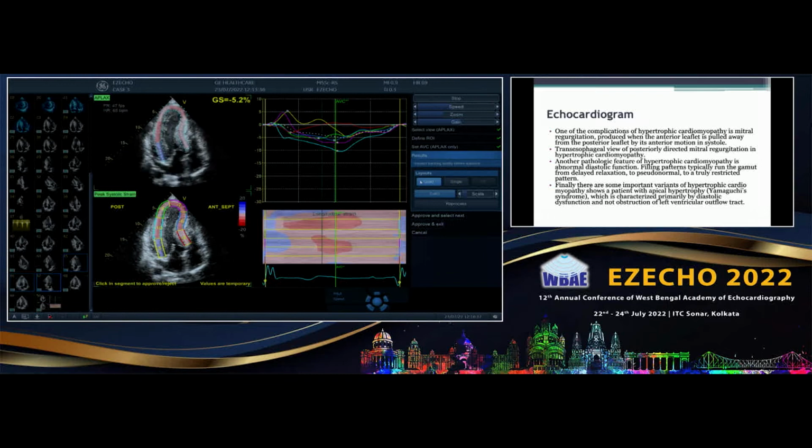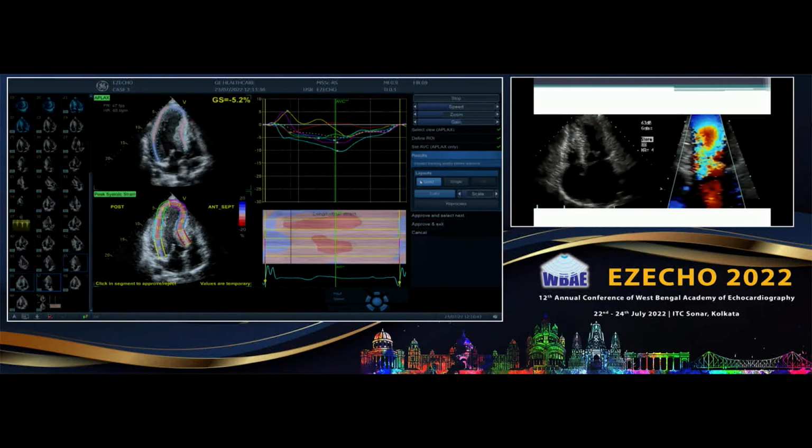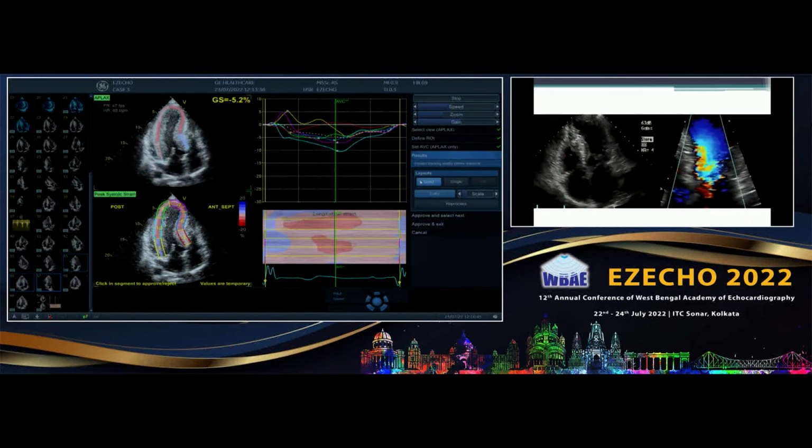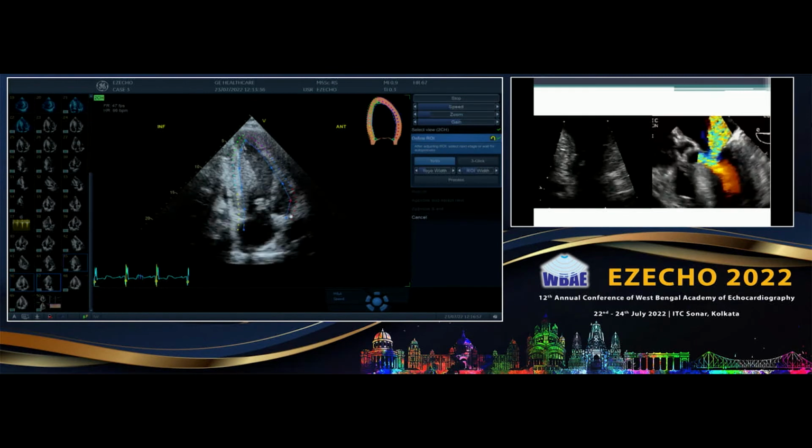What is the third point that can tell you this is a phenotype of a sarcomeric HCM? It is looking at crypts. If you have certain crypts, and that is especially when you use LV opacification contrast, you can make out, or MRI shows it because they already have blood which looks white. So if you have something going into the crypts, these crypts don't happen in other types of hypertrophy, and they are generally related to HCM.